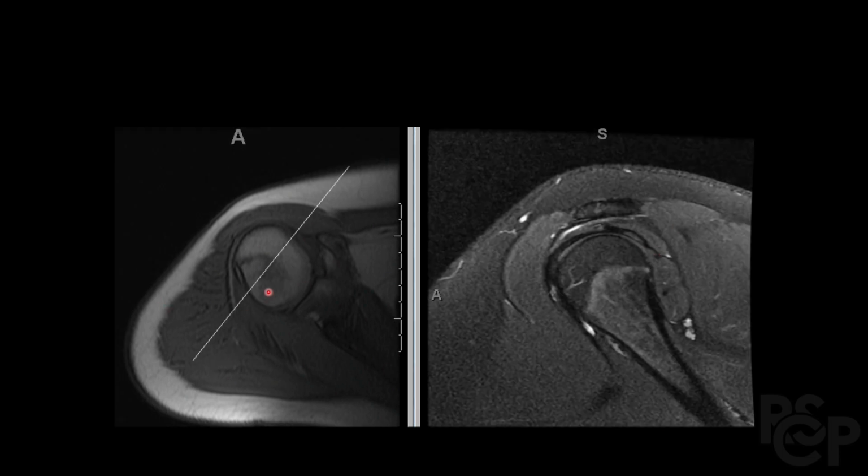Okay, and now we moved a little bit more lateral. One of the structures to look for is the long head of the bicep tendon, which is kind of right over here. It attaches here and then kind of works its way around here. So again, we went from more medial to lateral, this side being the anterior aspect and this is the posterior aspect. I hope this video was helpful in kind of just getting the basics of orientation down.